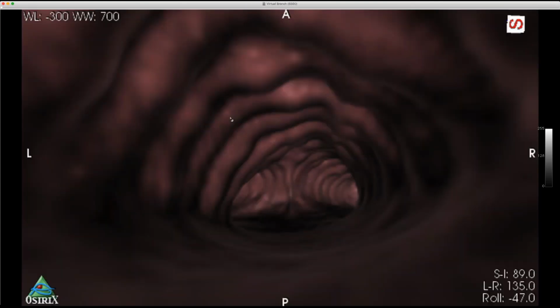So I confirmed my suspicions with a virtual bronch, and you can see all these what look like submucosal nodules going all the way down here. So I think this is another case of tracheobronchopathia osteochondroplastica as an incidental finding. And I've seen very subtle cases not infrequently, particularly in smokers. I believe this patient was a smoker, and I think this was a nodule follow-up. But I thought these were quite impressive and looked sort of like this.